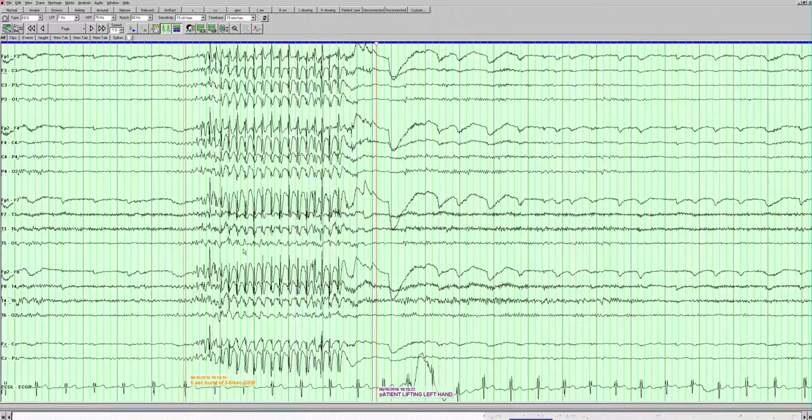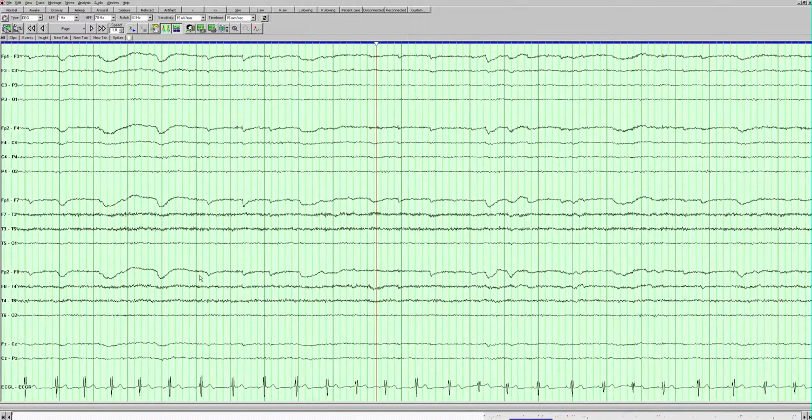Now that's important because there are types of epilepsy, frontal lobe epilepsy with a mesial frontal source, where you can see this very rapid generalization, so rapid spread, and we call that a rapid bilateral synchrony. So this is a pattern that you can see in focal epilepsy, and you can also see this in the primary generalized epilepsies or genetic epilepsy, genetic generalized epilepsy syndromes.